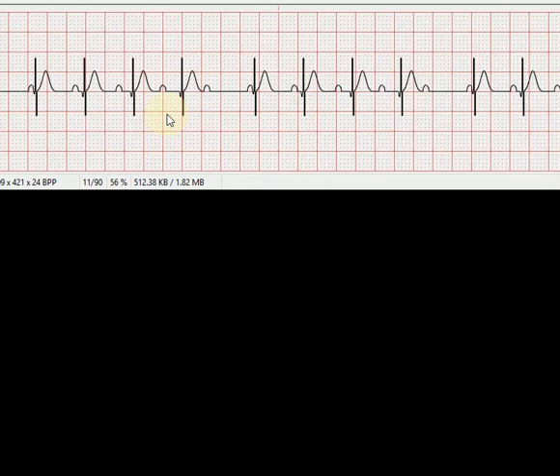We look at the R to R. Is it regular? Well, 1, 2.5 blocks, 1, 2.5 blocks. Oh, yeah, it is. 1, 2.5 blocks. Yeah, it's regular. Keep going. 1, 2, 3, almost 4. Ooh, no. Guess what? It's not regular. I have an irregular R to R.